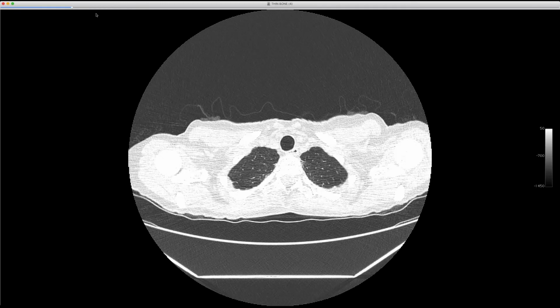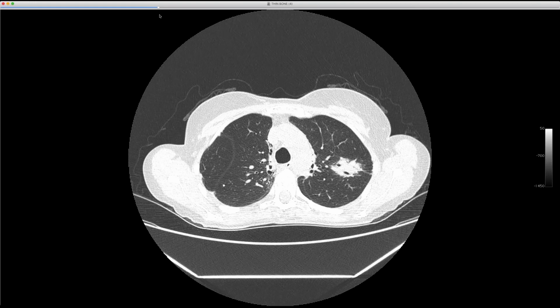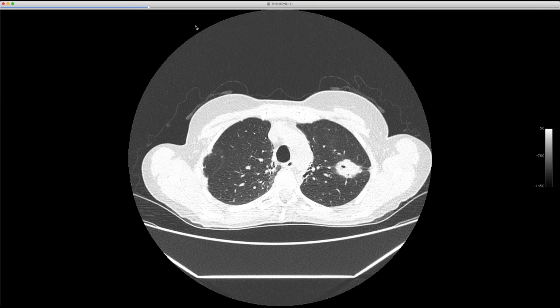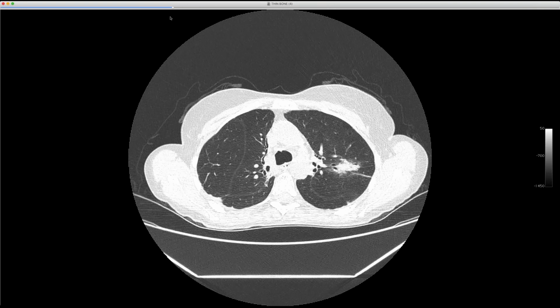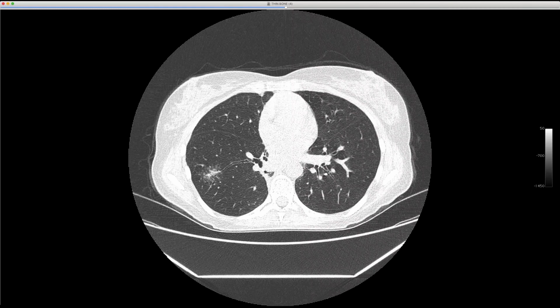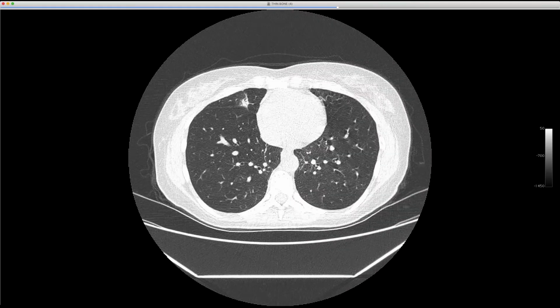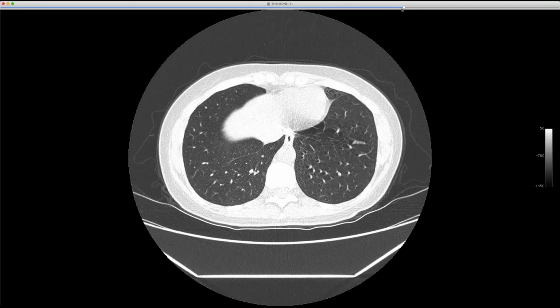Okay. All right. So he had been treated for a Hodgkin lymphoma some moons ago, and you see the paramediastinal radiation fibrosis, but then developed these lung opacities, and you can see in the left upper lobe this mass, air bronchograms, another one there, and those would fit for your more typical MALT lymphoma, preserved airways, discrete. But what I thought was kind of odd in this one is this cluster of nodules that to me is a dead ringer for a galaxy sign for sarcoid. And then had these smaller nodules, and then another nodule in the middle lobe there. So, some kind of lymphoproliferative disorder.